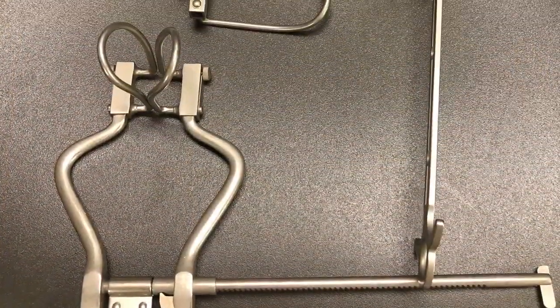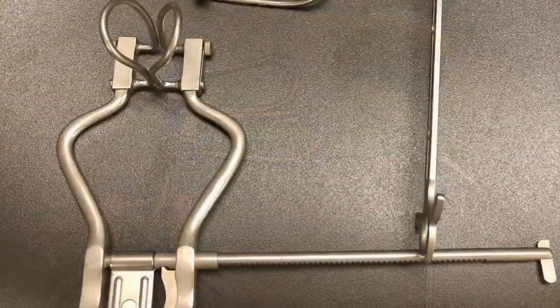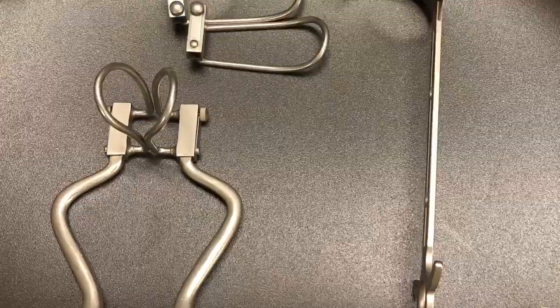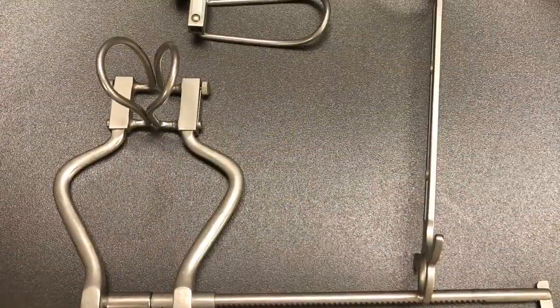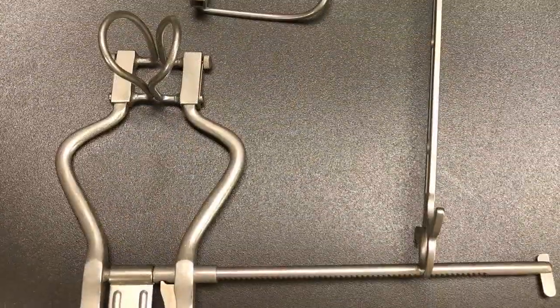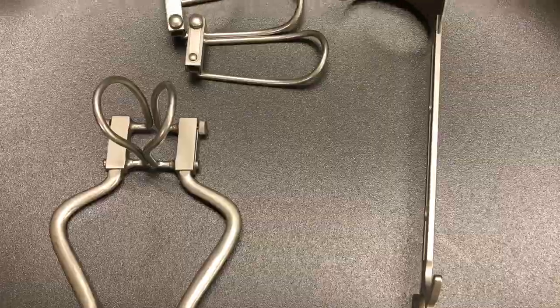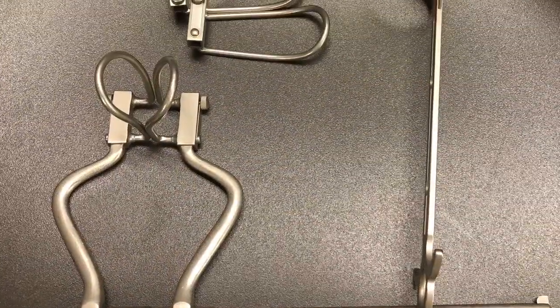This is the Balfour retractor with depth blades and a bladder blade. This is a self-retaining retractor. Don't forget this has a screw to tighten the blade down. This instrument is used for gynecological or bowel surgeries. All retractors are used to establish exposure for the surgeon in the body cavity or area of surgical exploration.